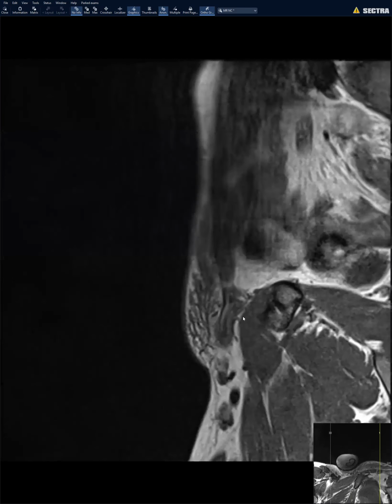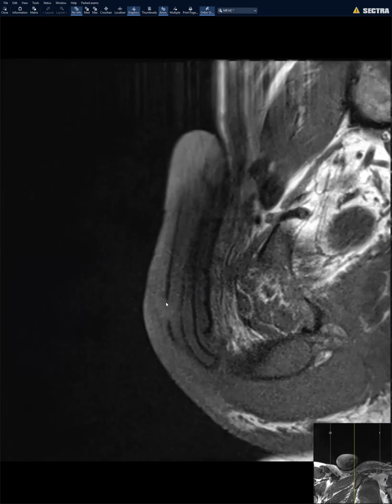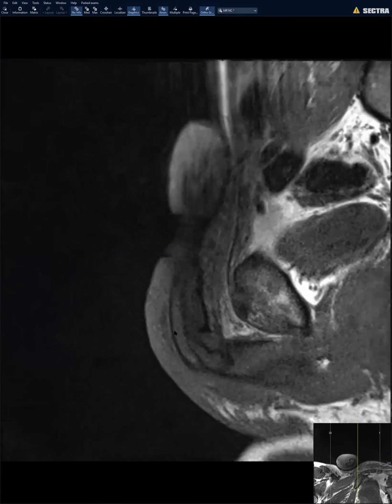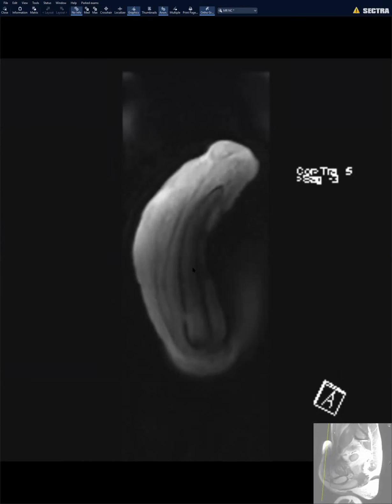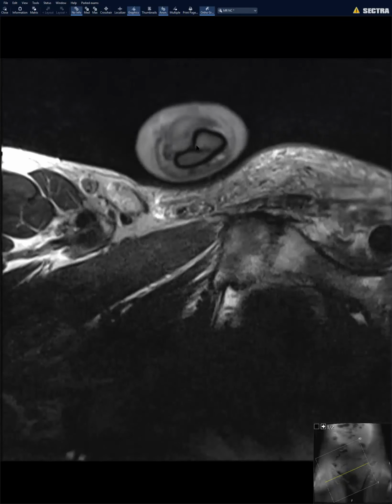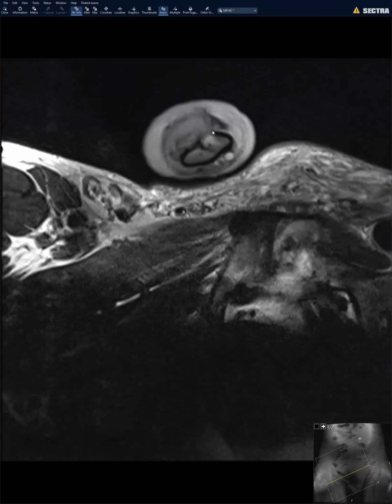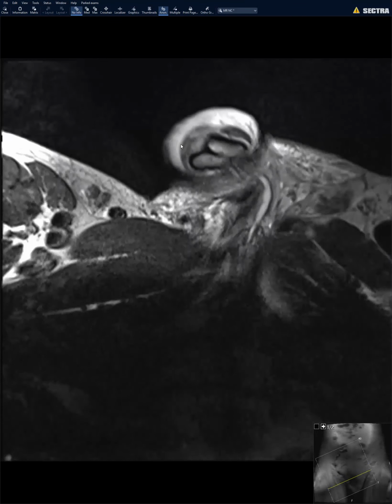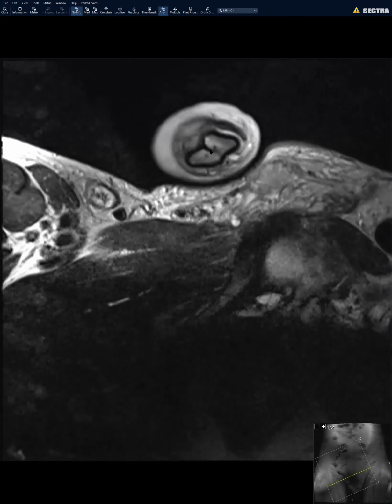Very nice. Did this go on to surgery also? Yes. So this is the defect on sagittal, and there's an associated hematoma. And on surgery, they found a 1 centimeter defect. Sorry, the images aren't as pretty because it was hard with this patient. This is the axial T2, which nicely shows the defect in the spongiosum and a hematoma associated with it. It was a good ultrasound MR correlate. I think that's all I had.